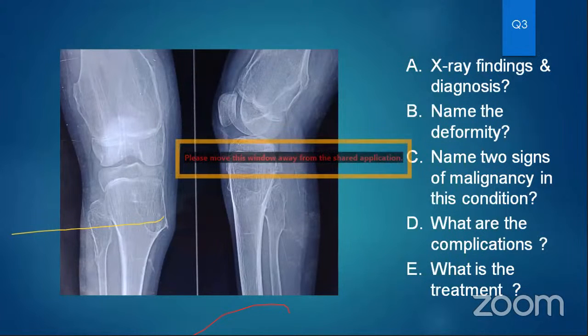Skeletally immature. X-ray. So, location.